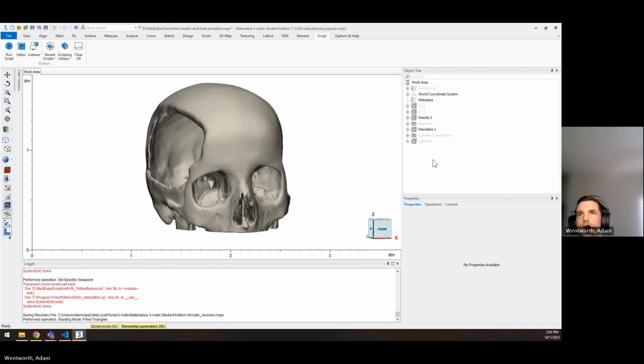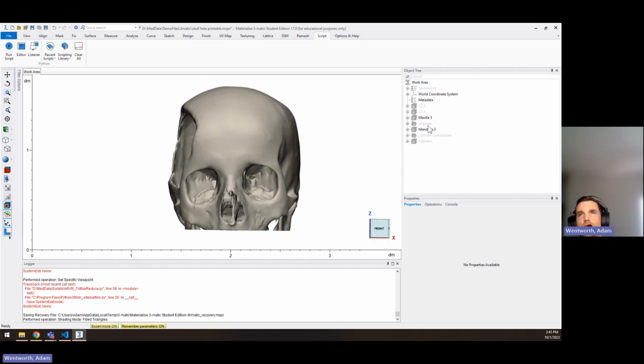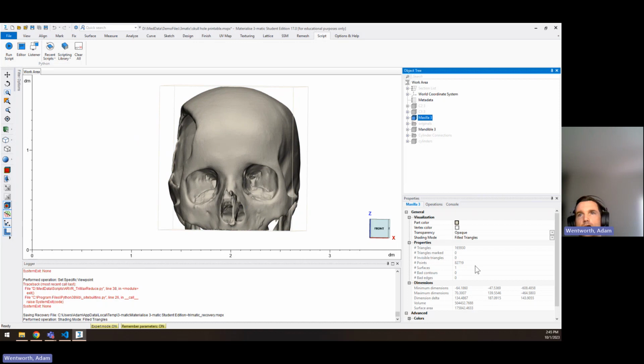So we would like to do this very quickly and for a large number of 3D files, to have essentially a limiter that would reduce the total number of triangles under a threshold. So if you want to see how many triangles are in any model, you can just click on it, and underneath these properties, you can see the number of triangles right here.